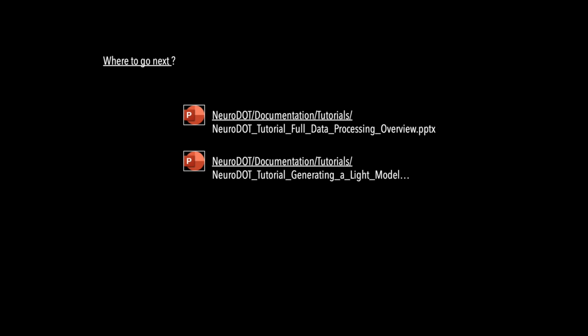With NeuroDOT and NIRFASTer installed, you are ready to begin data processing. Several PowerPoint tutorials on light modeling and data processing are included with the NeuroDOT distribution. These will give you a deeper understanding of how finite element analysis is used in the processing pipeline.